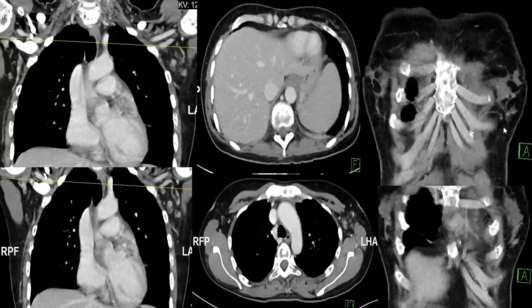You see this lesion, and surrounding subtle distortion corresponding to that area seen on mammography. When they showed this image, we raised the suspicion that this lady most likely has the primary in the left breast, breast cancer with axillary lymph nodes.